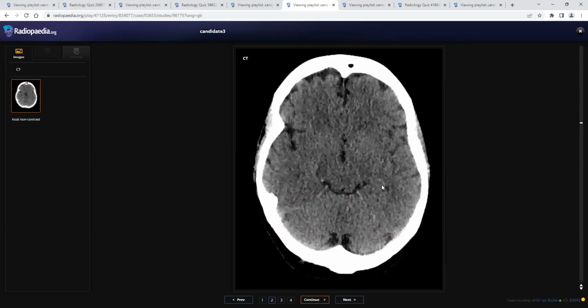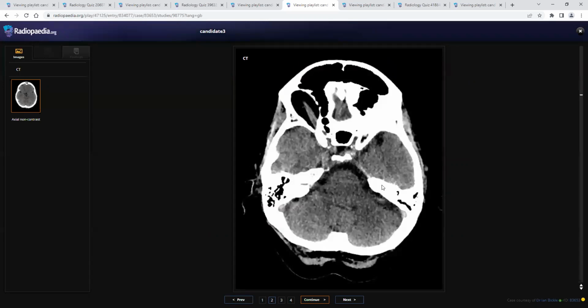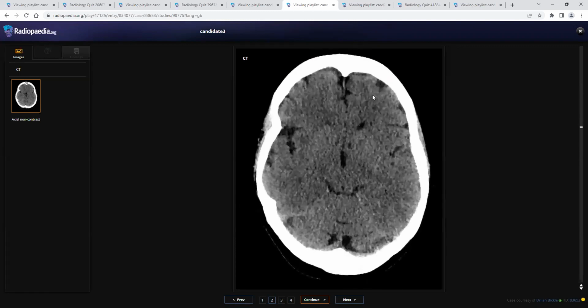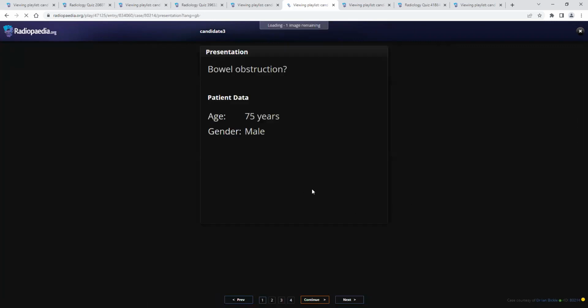Okay, good, you did well. As I told you, emergencies are the main thing in the FRCR exam. You should not miss any emergencies, and you should be confident. You should be more confident in your diagnosis. You know your stuff. You should be more talkative and more confident, and come to the diagnosis at the earliest moment, so that you can see more and more cases. This is the right hyperdense PCA sign and acute infarct. No complications.